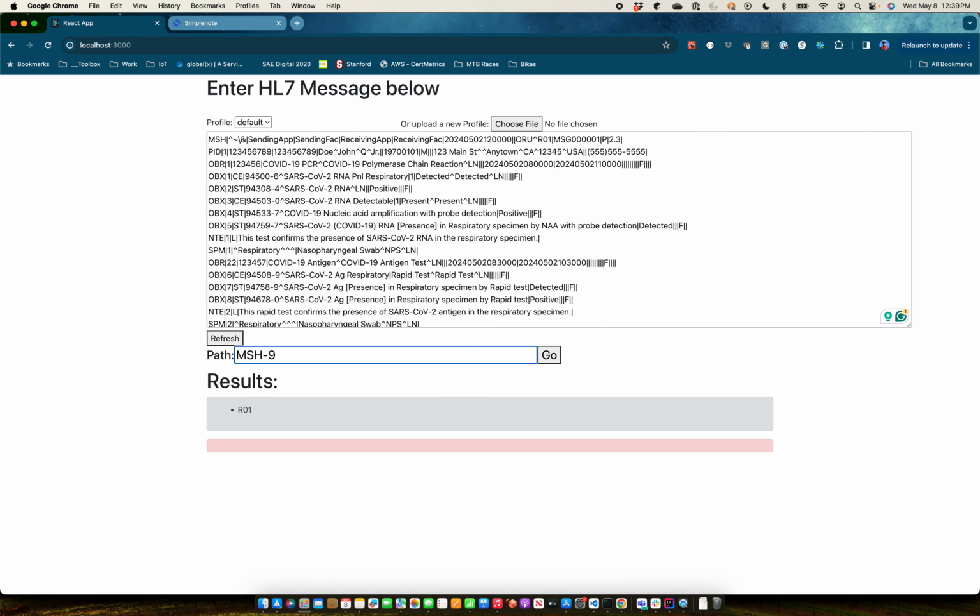Now, one thing is the library will never give errors. So let's say, for example, I ask for MSH34. We saw that field 12 was the last one, so there's no MSH34 in this message, but all it says is no results match. It doesn't give you errors or anything, it's just best effort. The same with the ninth element. If I ask for 9.1, we saw these components, but if I say 9.2, 9.3, there's no results. There's not a third component to that. So it's not erroring out, it's just telling you it couldn't find anything on MSH 9.3.